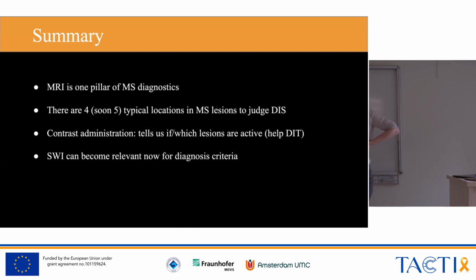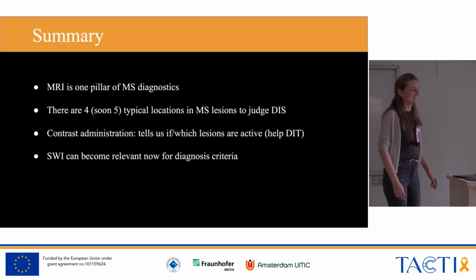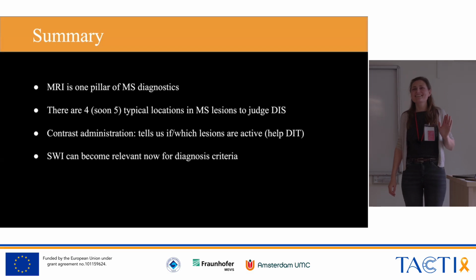Okay, so here the master question. Say you have an infratentorial juxtacortical cerebellar lesion. So the cerebellum, of course, has its own cortex, and you have a juxtacortical lesion at the cerebellum. Then it's both juxtacortical and infratentorial. Does this count as 2 locations? Yes. No. So sorry, but this combi deal is not allowed.